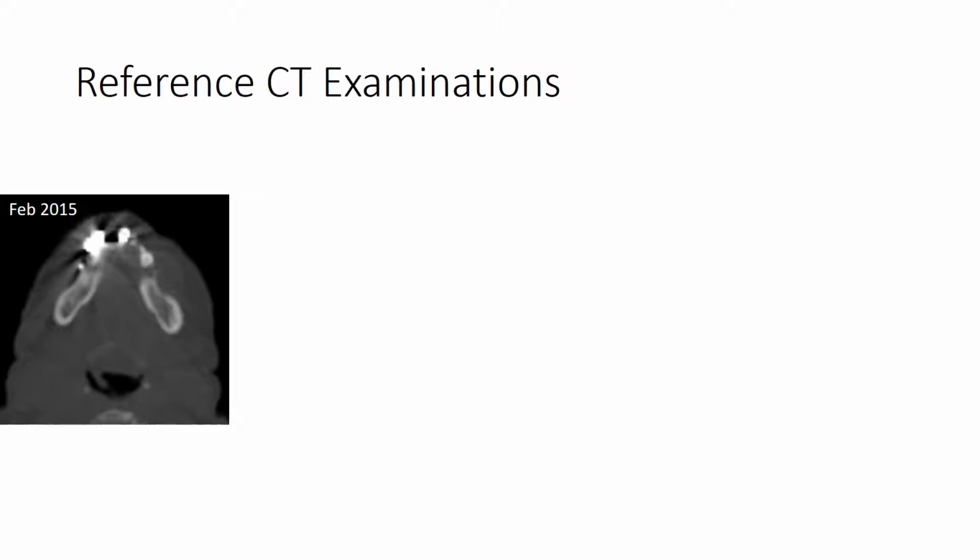So I went back and looked at this patient's history, and she had multiple PET CTs to follow up on her cancer. And PET CTs, it's a whole body CT along with the PET imaging. And the CT is not really of high resolution or diagnostic quality, but it did allow me to figure out what was going on here. So back in 2015, you had pretty symmetric and normal appearing trabecular pattern.